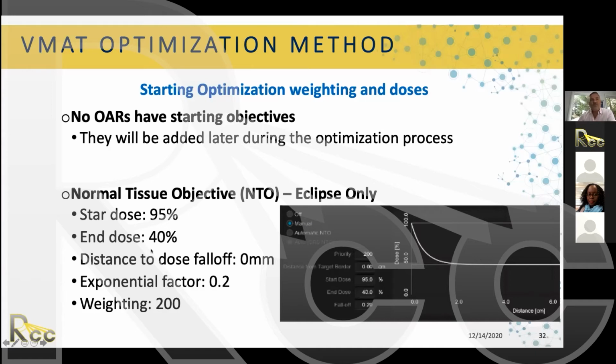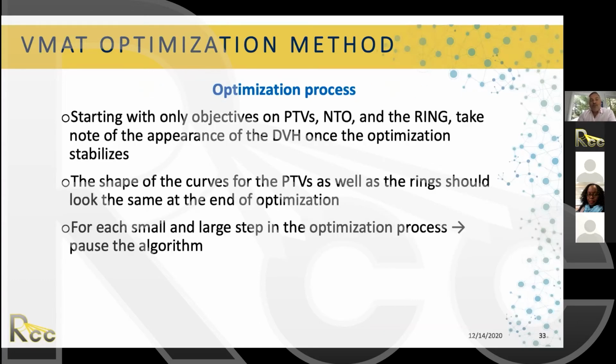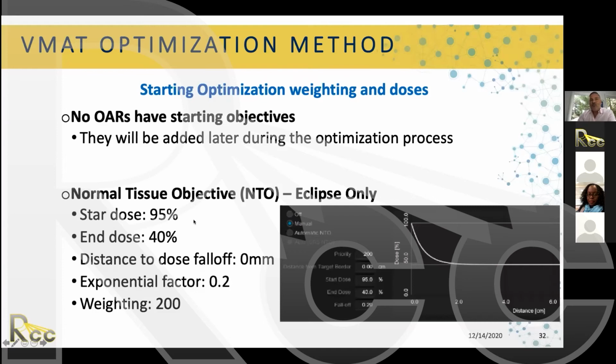This is the graph that you will see from the system. And basically that's how you will know more details of this when we give you the tutorial videos for the head and neck case and the pelvic case that we did for you. You will know exactly what each parameter means. So I didn't wanna waste too much time here.